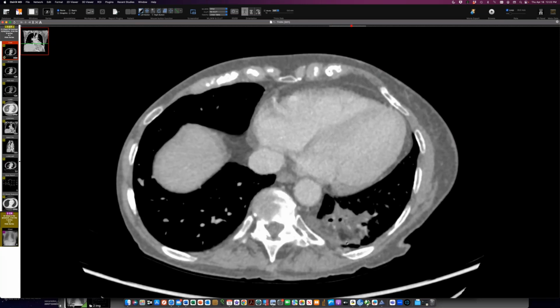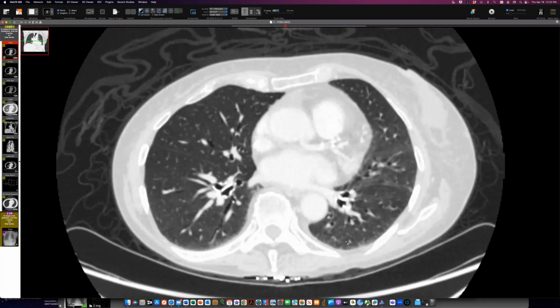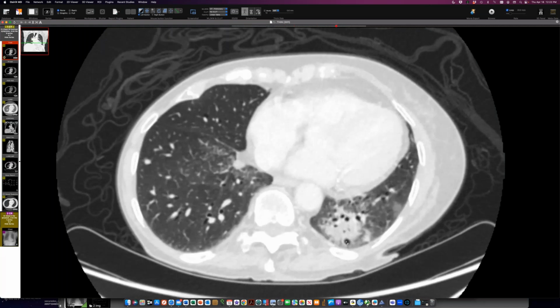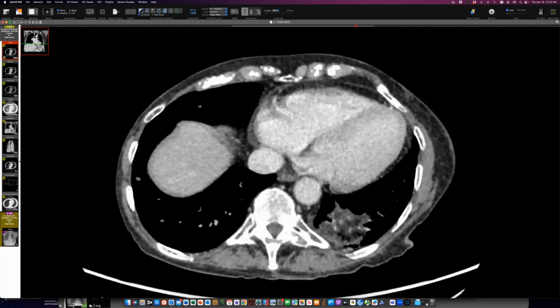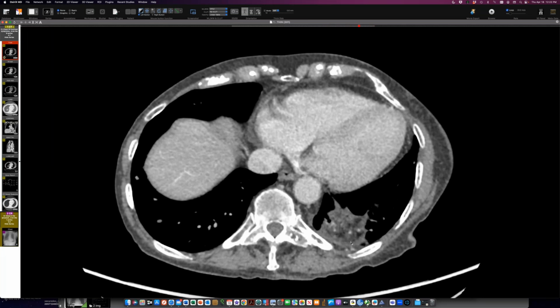And let's see if there's any on the other side, because aspiration is often bilateral. Okay, so mineral oil aspiration. Nice. Okay. So David, I decided your big fat atoll is just, from the olden days before there was this rising sea level and the island was much bigger. Before we started using all this mineral oil and warming everything up. That's right. But yeah, I think you're absolutely right about that.